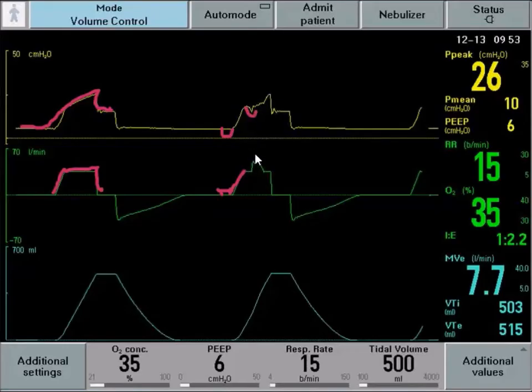If we look at the flow waveform below that, it allows the patient to get more flow. So it is changing the breath pattern from a volume control breath to more of a pressure control breath. If this lasts long enough, flow is going to decelerate and end the breath on flow criteria, much like a pressure support breath. This additional flow may lead to a higher tidal volume.